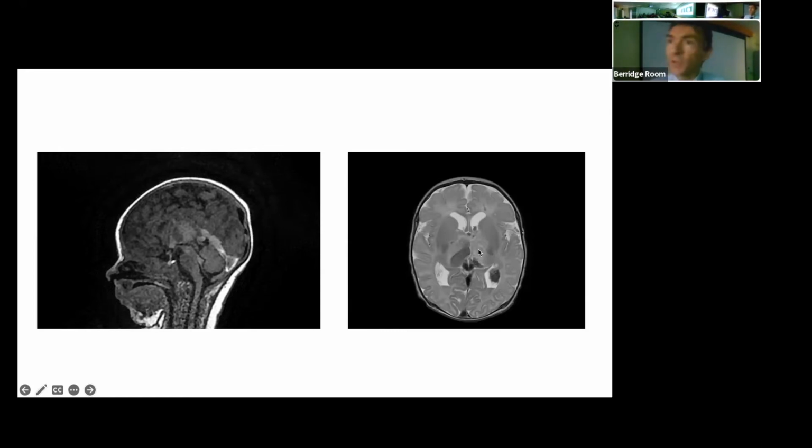And this is a T2 weighted image taken at the same time, showing the edema. The blood, acute blood doesn't show up as well on T2. But some of this low intensity is probably representing the recent blood. And this that we know from the CT is kind of thrombosed straight sinus, and vein of Galen is showing us low signal. So that's quite confusing on T2 because it looks similar to flow void from flowing blood.